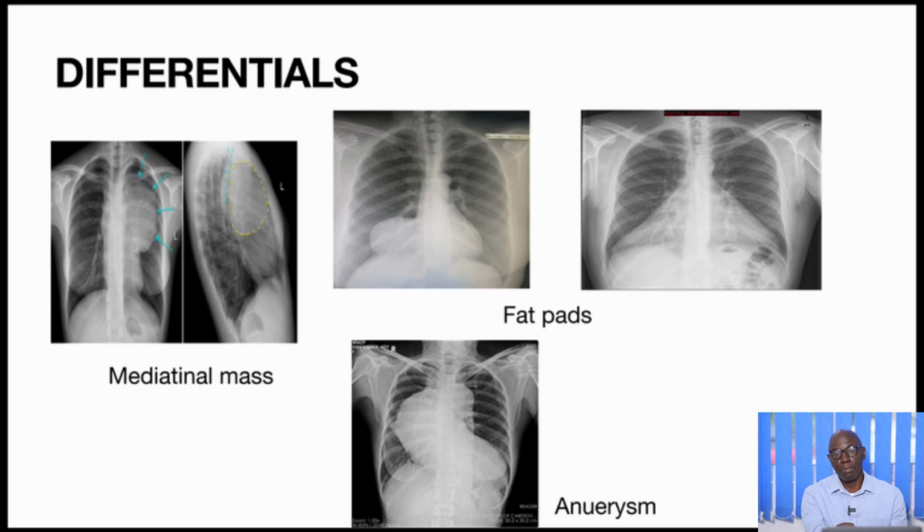If I can just recap a few things here, the most important of all is, one, you must have a well-taken radiograph, non-rotated, full inspiration, and it must be a PA. And when the cardiothoracic ratio is more than 0.5, then you need to look at the heart carefully and see if it is a specific chamber enlargement or generalized cardiomegaly. The differential diagnosis may also be borne in mind. These patients usually benefit from echocardiography.